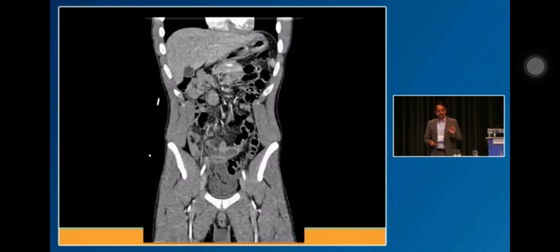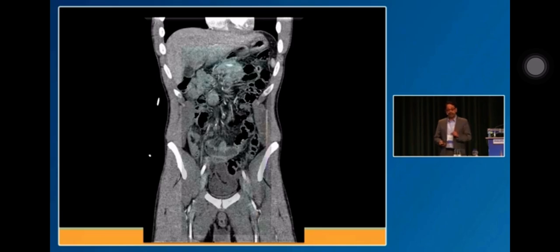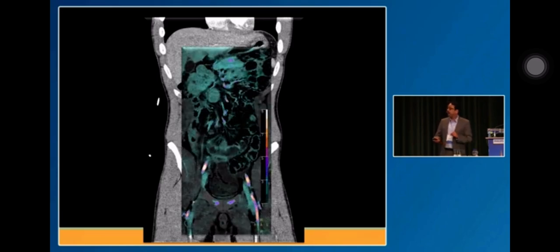In trauma, absent iodine uptake in bowel loops is a very, very good indication of bowel injury. This loop in the pelvis that you see has no iodine uptake. You can see that loop. It's a U-shaped loop. This was a bucket handle tear that was confirmed on surgery.